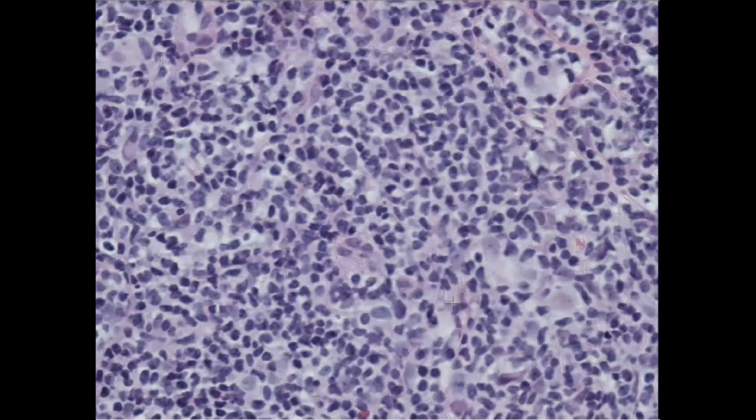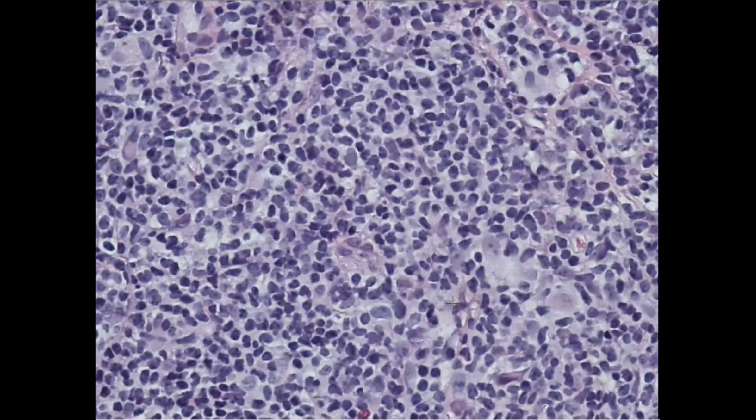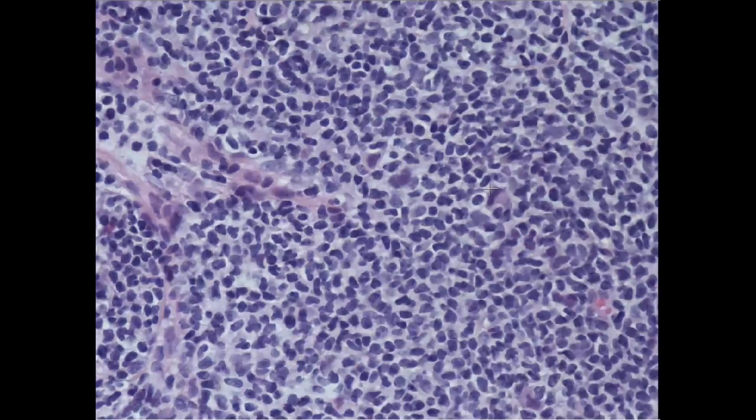Yeah, so this cell, I consider it a Reed-Sternberg cell. I'm trying to focus, yeah. And this is a mummified body. And actually I noticed that the mummified bodies, I can notice them from low power as dark dots. These are also mummified bodies, this one and this one. Let's go see the other case.